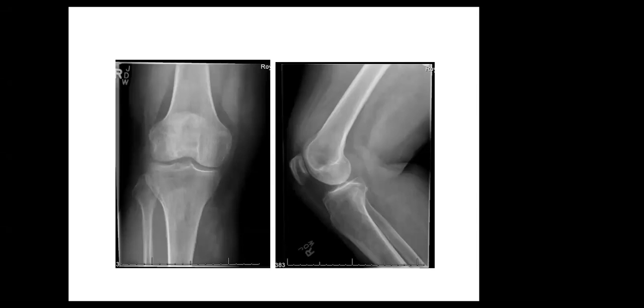And there is soft tissue swelling at the upper aspect of the leg.